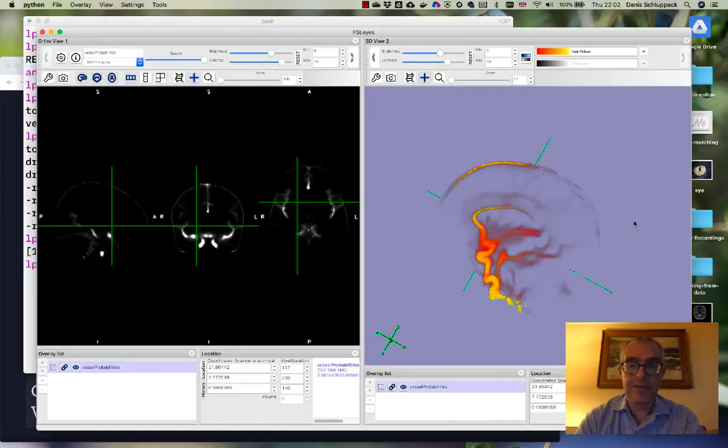Okay. So the other thing you might want to do is, now that you know what this probabilities file looks like, you could maybe look at the other files that contain information about the radius and so on, and start thinking about how you could combine this information from the atlas with a single observation, right, a single MRA that way from our particular participant.